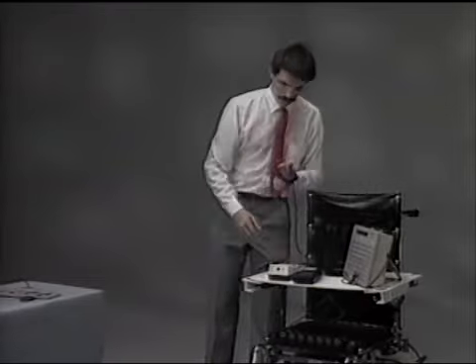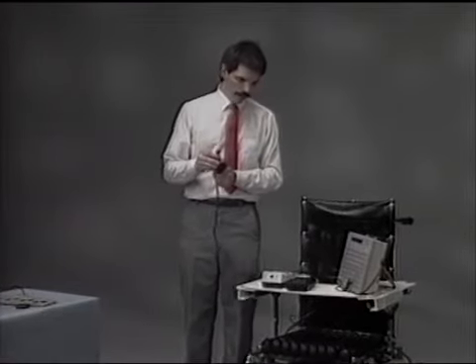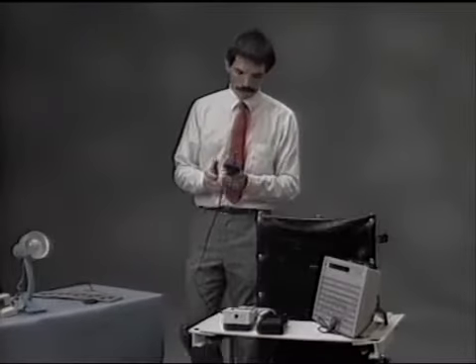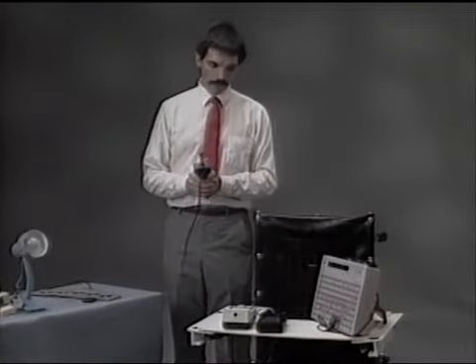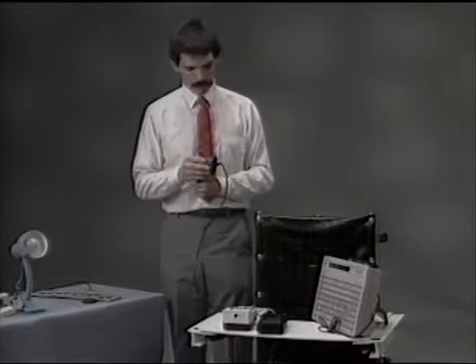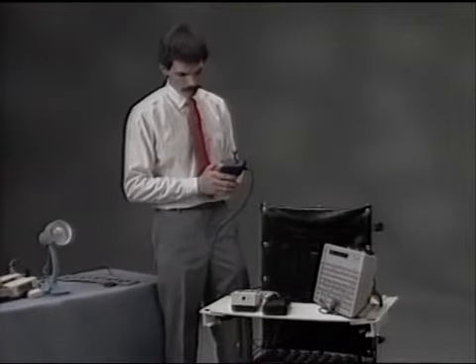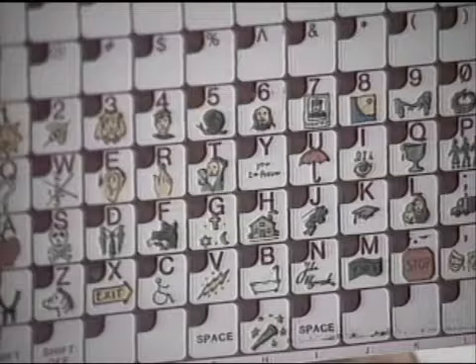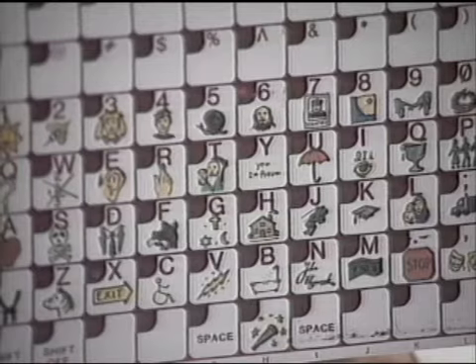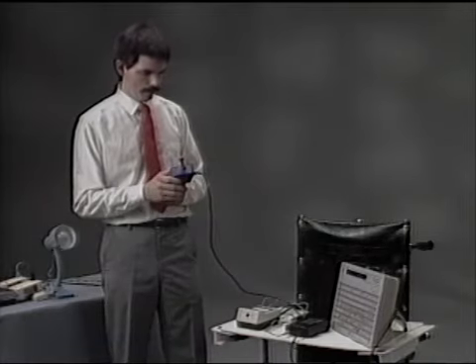Let me demonstrate that. First, we can now scan into the speed mode and actually come in and drive into our room. We can scan into the environmental control mode and maybe turn on a little music. And then finally we can scan over to our communication aid mode, and I can communicate. Good morning.